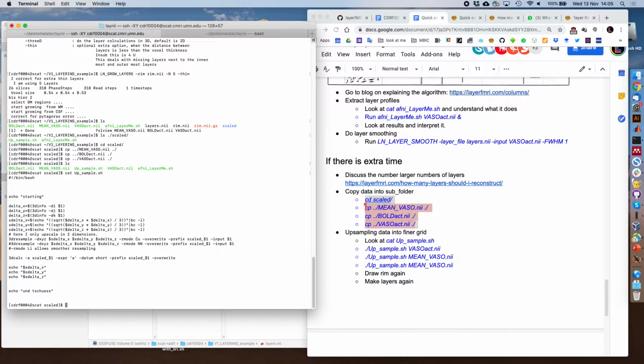So let's look at that. This is an AFNI command that basically divides your resolution by a factor of 3. You can choose your interpolation function. Here I use cubic. You can use nearest neighbor. There people really have different opinions. I see the way how we acquire data as a rectangular grid where we have a sparse sampling and we sample points like voxel centroid values.